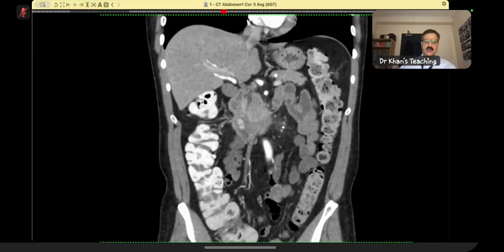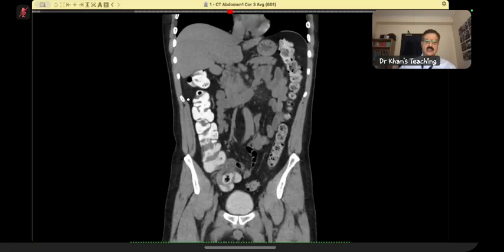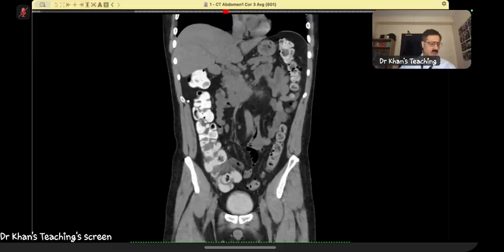And as far as the duodenum is concerned, you've got these blushes there, for which you can confirm it in the exam. Always ask for non-enhanced. And in the same breath, you should say that I will confirm it with a non-enhanced scan. Okay, thank you. So let's go to the next case. So now you have seen two cases of PAN, with slightly different clinical presentation in both of them.